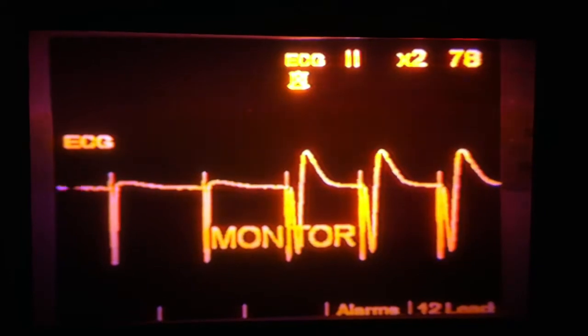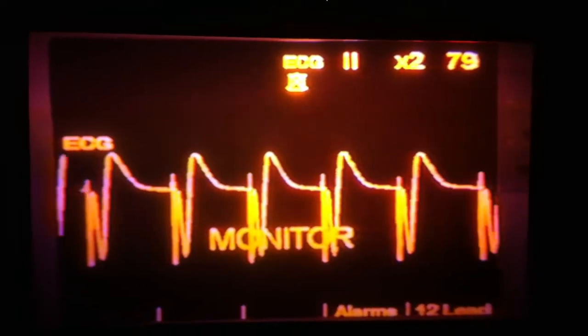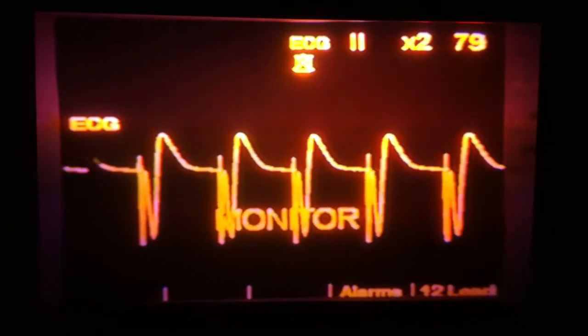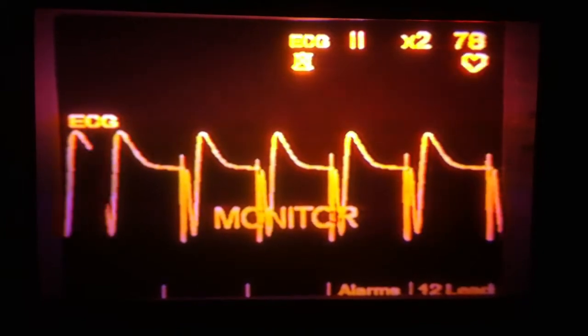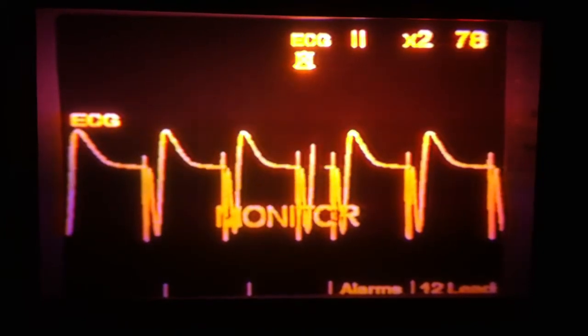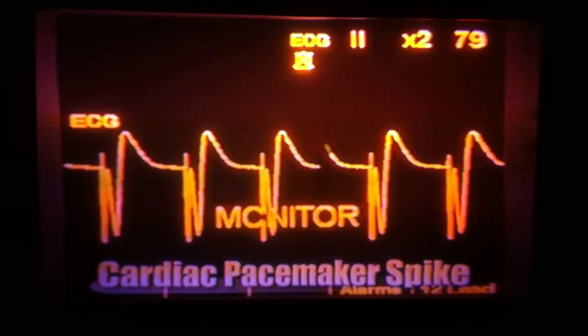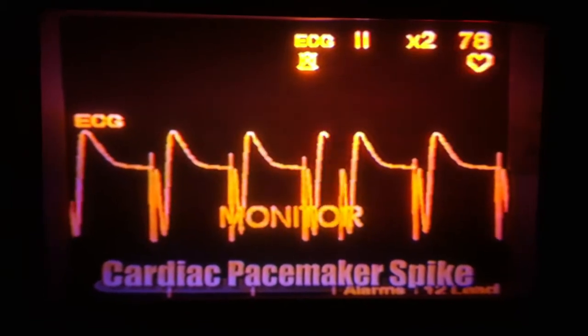Most pacemaker rates are set between 60 and 80 beats per minute. The term capture is used when a pacemaker spike is seen on the monitor with an immediate wide QRS complex. Newer pacemakers are designed to sense the need for an impulse. Therefore, patients with pacemakers may display only an occasional pacemaker spike or may be completely dependent on the pacemaker for every complex.